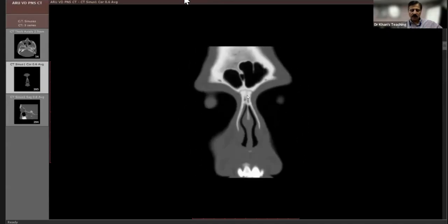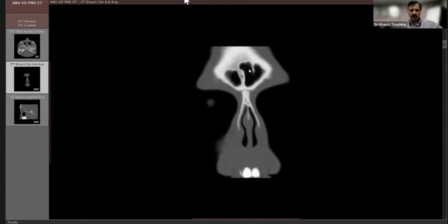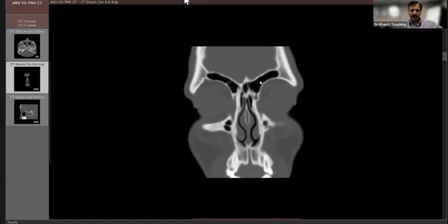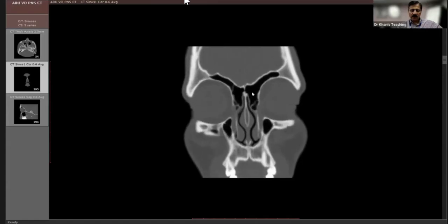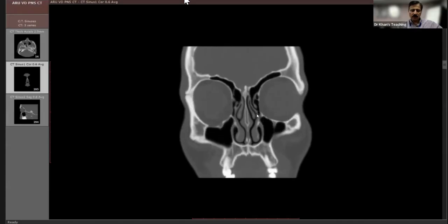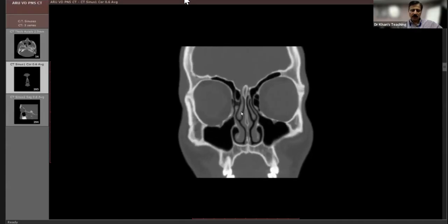This time, our aim is to see the frontal sinus. So this is the frontal sinus. And you can see that there is a groove here. And actually, you might be able to see in some cases very well, but somewhere here, and actually you can see it here, where I am pointing out. Do you see this lucency, which is continuously going like this?